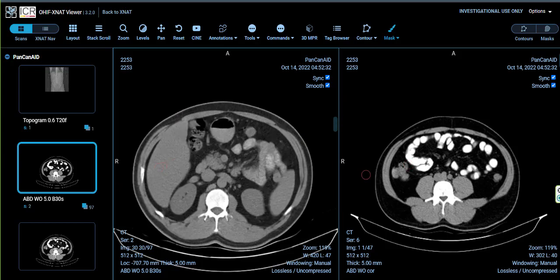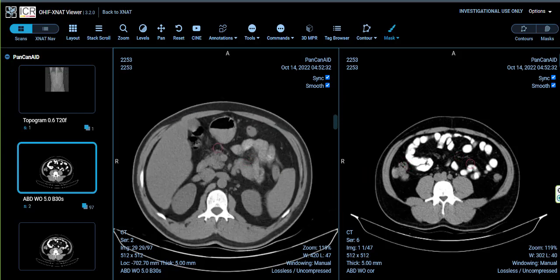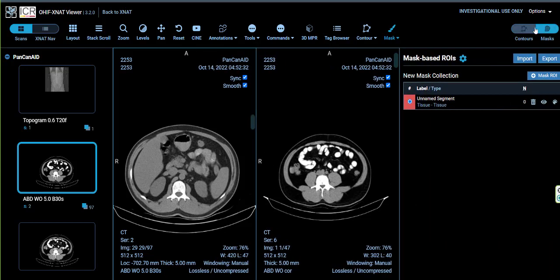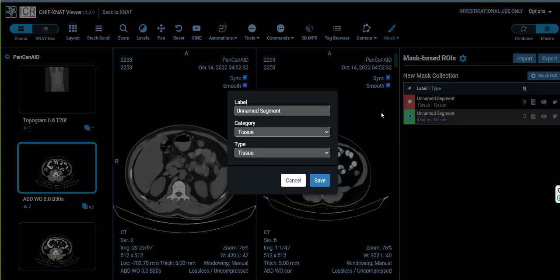So let's move on to this part. Here in the top right corner of your web page window, you can see these contour and mask. You can actually define different masks, so please ask your project administrator for these masks. You should usually have a unified way of labeling.